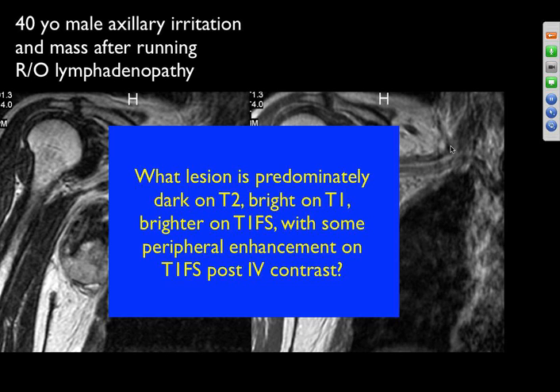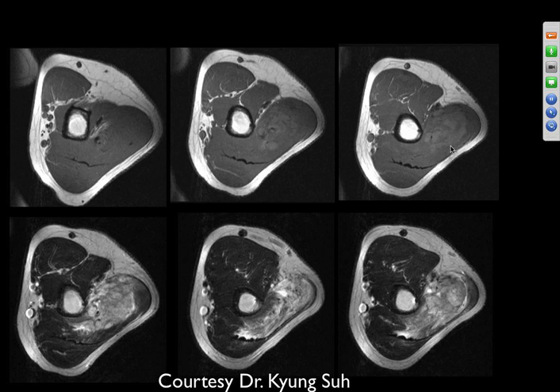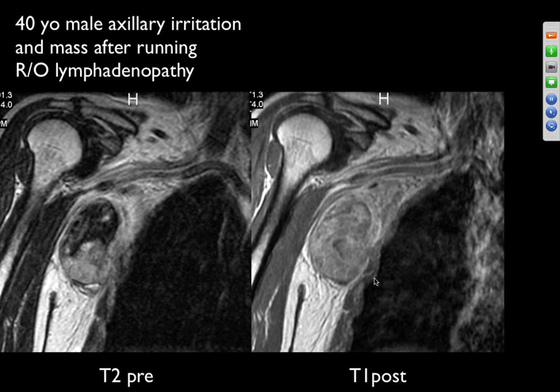Okay. We saw this lesion, and we actually suggested the cell type from the MR. If you notice here, it's bright on the T1 weighted image, which makes you think of fat, but it's very inhomogeneous on the T2. Oops, I'm sorry, this is the wrong one. Sorry about that. Here's the T1. On the T2, you have some areas that are low in signal.